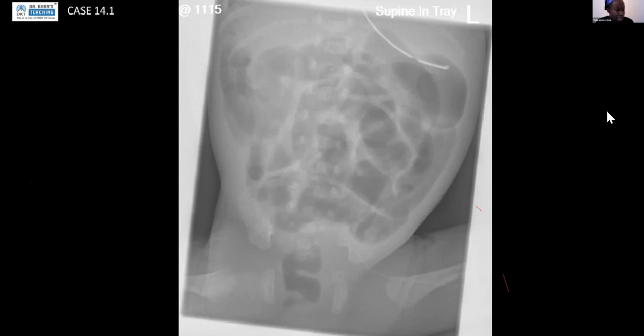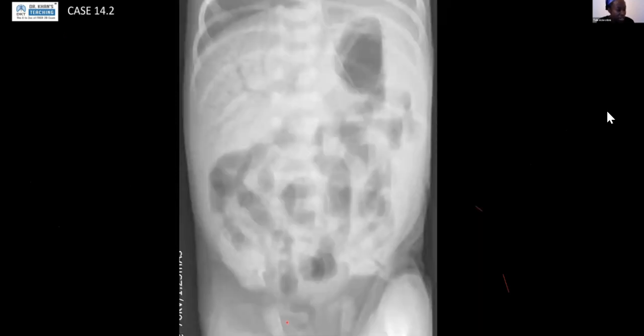So speaking of typical findings and things that demonstrate NEC, we can see here, as candidate 3 described, you have linear branching lucencies over the liver shadow, and they reach to the capsule of the liver, all the way out to the periphery, and this is in keeping with portal venous gas. If this was biliary gas, it wouldn't reach all the way out to the periphery, it would stay more central, so that's how you can differentiate between the two.